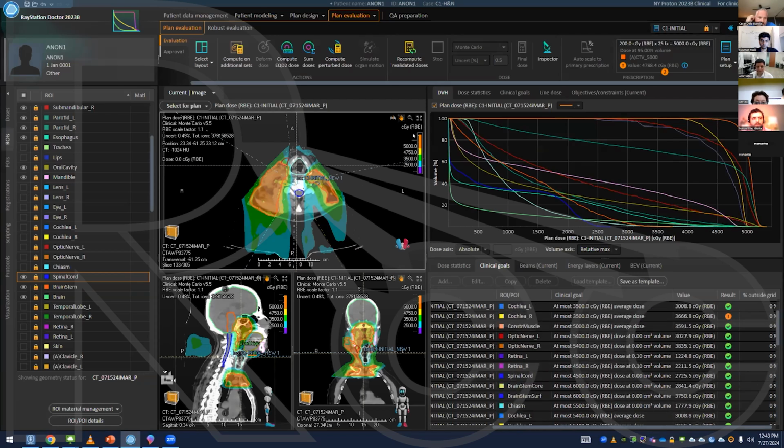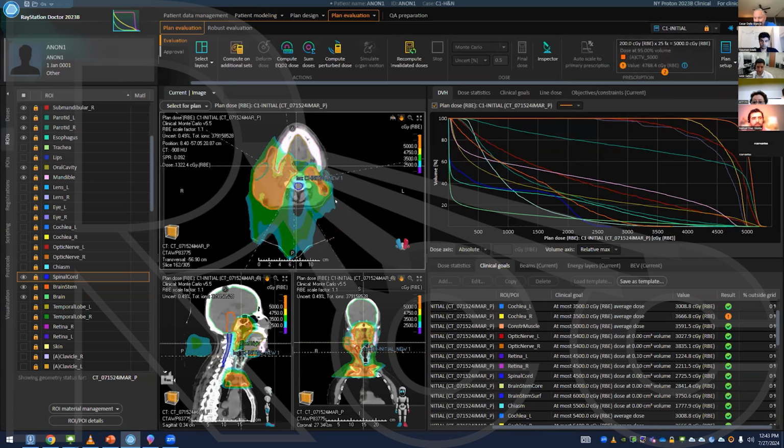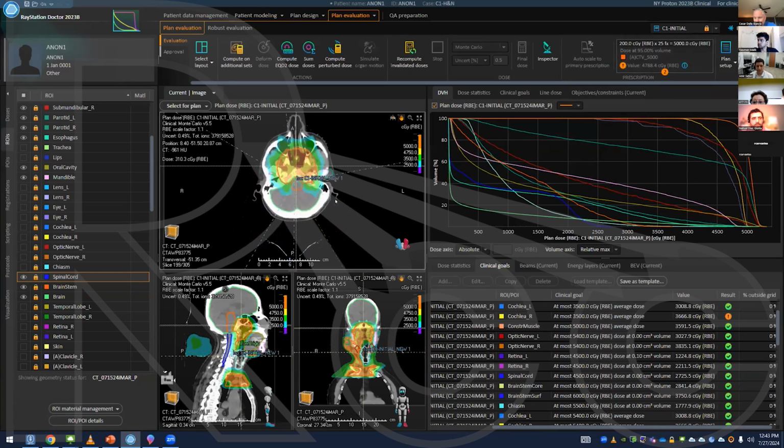The organs at risk we've evaluated. And then the last part, the P, you want to review the prescription. So for this first phase, 50 gray radiobiological equivalent in 25 fractions. Other than the organs at risk, which I asked the planner to fix, I was generally happy with this plan. So we'll do the first phase, hopefully achieve a clinical response, and then replan him for the second phase to 70 gray.